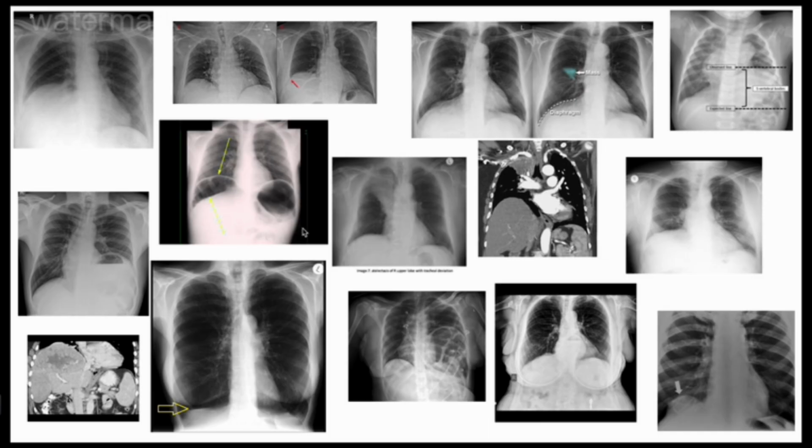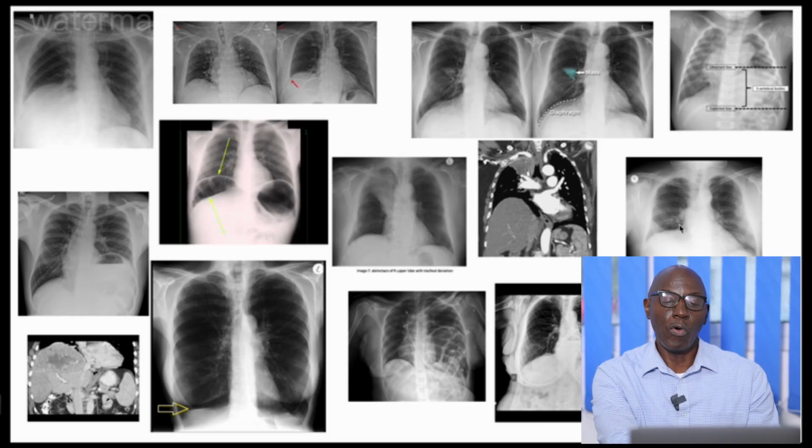It can be bilaterally raised in ascites, or it can be unilaterally raised in those conditions. So it is very important also to look for eventration and deformities in the hemidiaphragms. Good. That covers the hemidiaphragm and the conditions in the hemidiaphragm, and we are ready to go to the mediastinum.